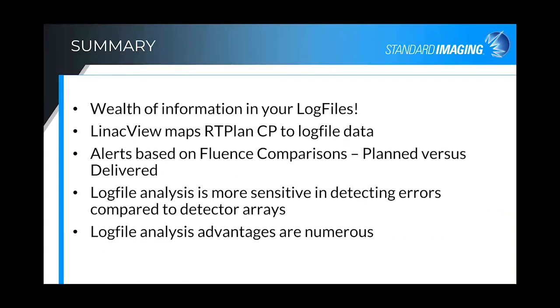So in summary, I hope that I've convinced you that there is a wealth of information available for analysis within your log files. LinacView software maps the RTPlan control points to the log file data. Gamma analysis of the Fluence comparisons occurs between the plan versus the delivered. Comprehensive analysis tools are available. As well, log file analysis is more sensitive in detecting errors compared to detector arrays. And log file analysis advantages are numerous for all treatments, but in particular for the adaptive workflows.